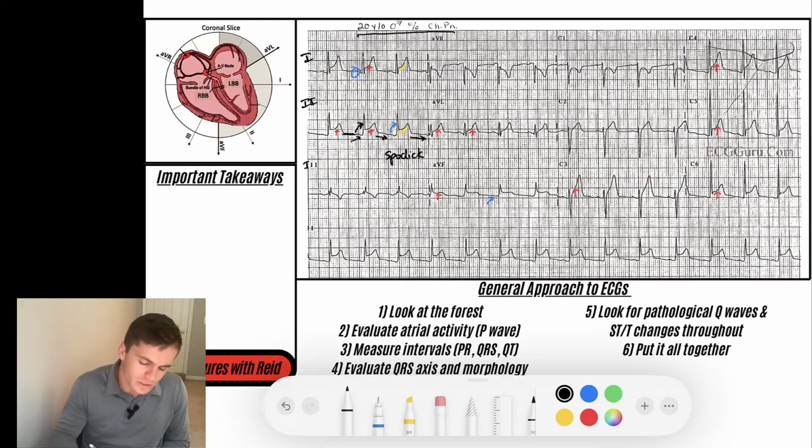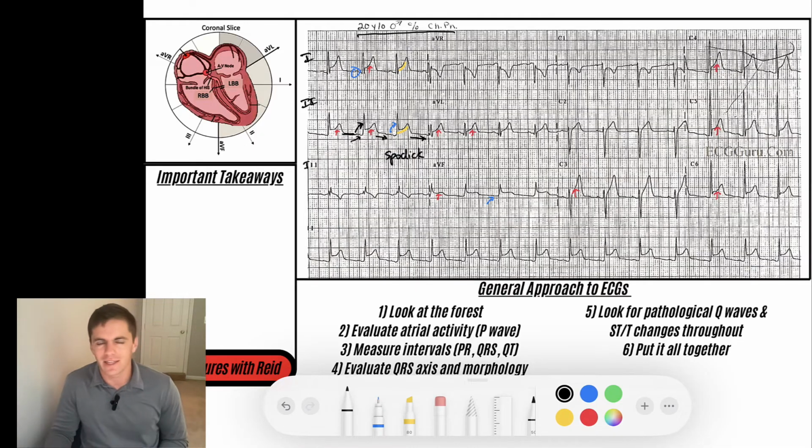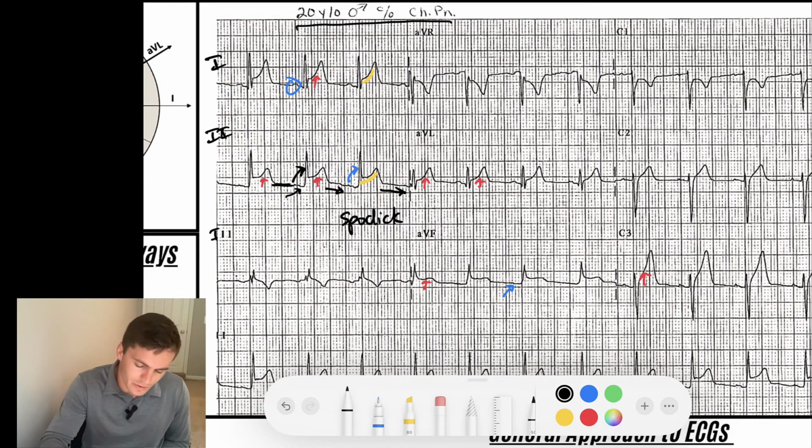And so you might think in this patient, if it's positional pain, you can see here the vignette, that's a 20-year-old with chest pain. You know, they're not in the demographic to have an MI. They surely could if they had some anatomic variations that might put them at higher risk or some genetic abnormality. But in this case, do they have a history of recent virus? All those things. Here we've got our ST depression in AVR.